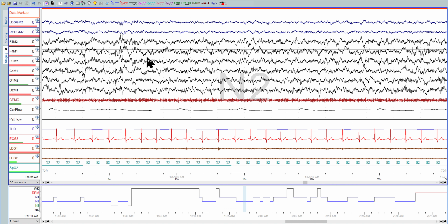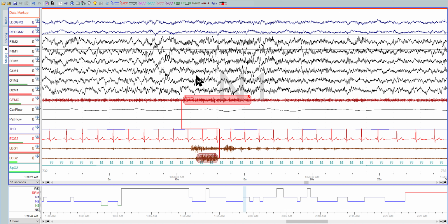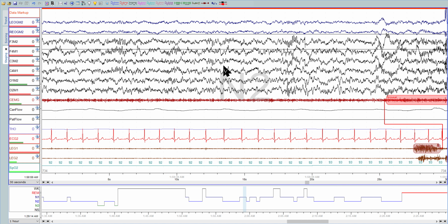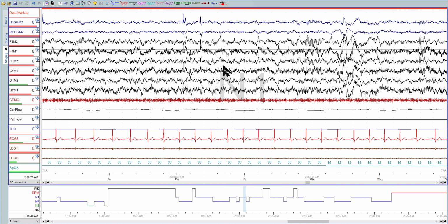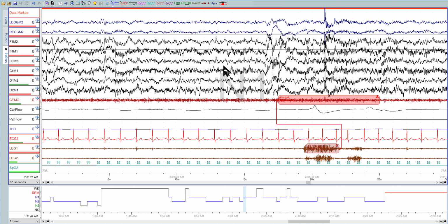And 2, 2, 2, 2. Good arousal. I think I'd drag it out just a little further. That would be 1 like you have it, and then 1 again like you have it. Good. Then 2. And 1. And then 1, good. And 2, good.